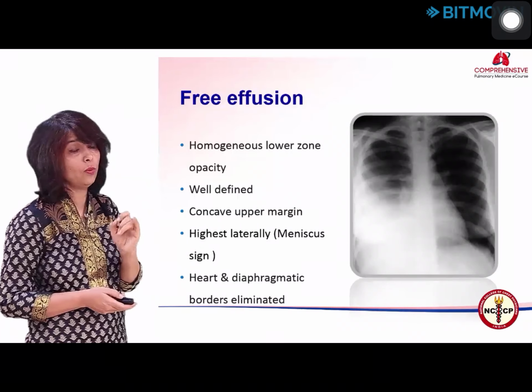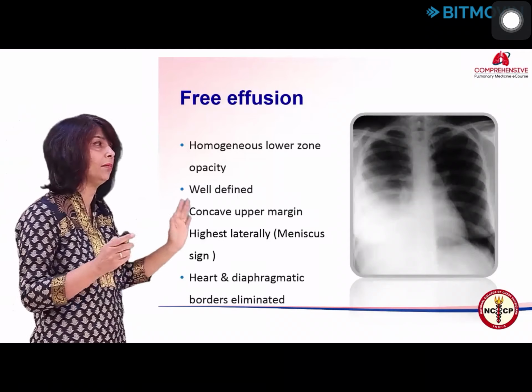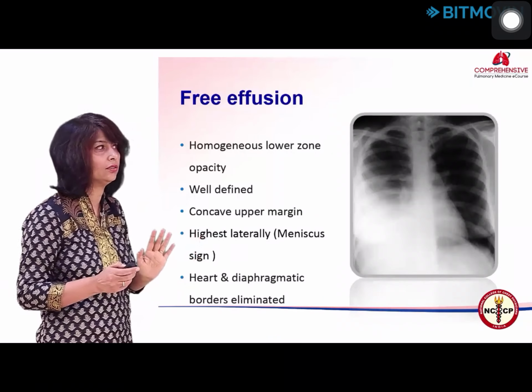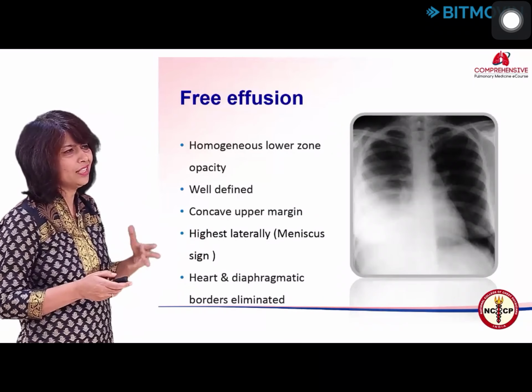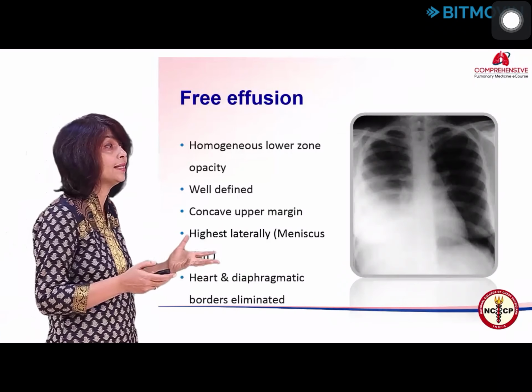Homogeneous opacity. So this is one, you'll see this is the first time I used the word homogeneous. Why? Because I came out of the lung, so I can call it homogeneous. Can something be homogeneous in lung? Yes, whenever it's filled with water, like a cyst.